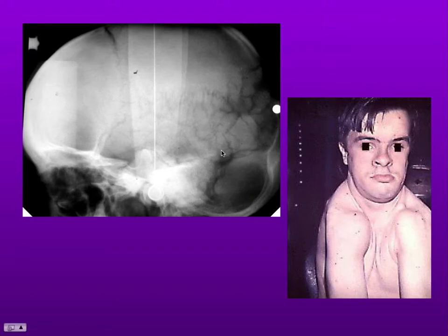There are too many suture lines in this patient, far too many. And the fontanelles, something that we see in children, in babies in fact, are still patent. This is the same patient as I just showed you on the panoramic radiograph. And here we have a remarkable appearance of a patient who can approximate the shoulders in the midline.